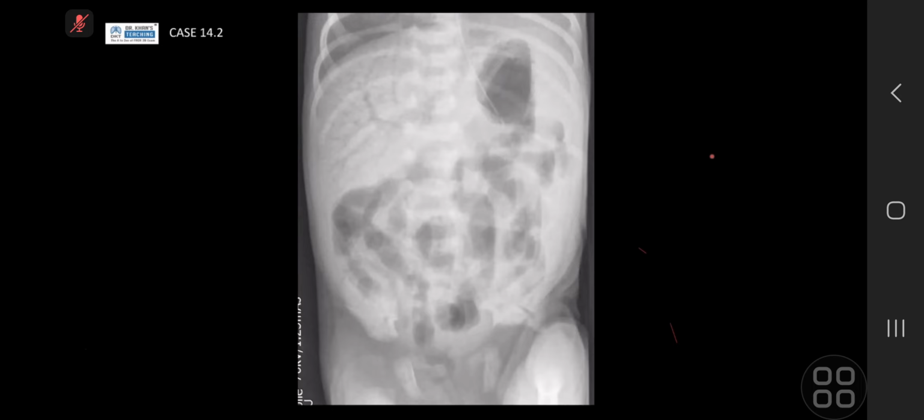In this frontal radiograph, I see there is bowel dilatation, as well as intramural lucency in the wall of the bowel going with pneumatosis intestinalis. I see there is also gas going into the portal venous system, from the portal vein to the peripheral hepatic region.